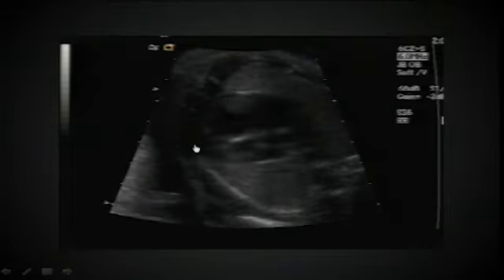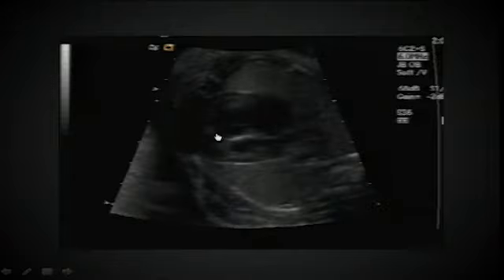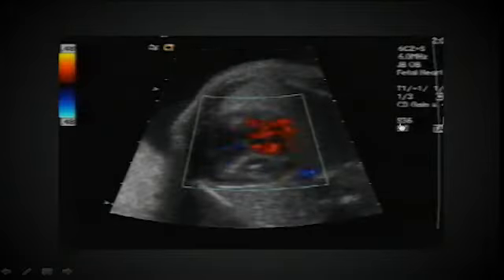So this is another baby. Posterior to anterior, apex pointed towards the left. Looking at the chest, the heart size: the heart occupies about 1/3 of the chest. So we see right ventricle, right atrium, left ventricle, and left atrium. What can you tell me about the right ventricle?